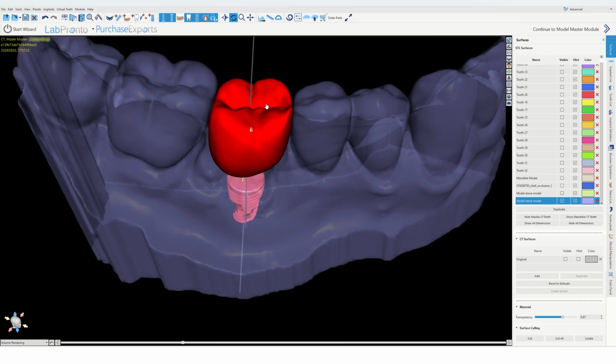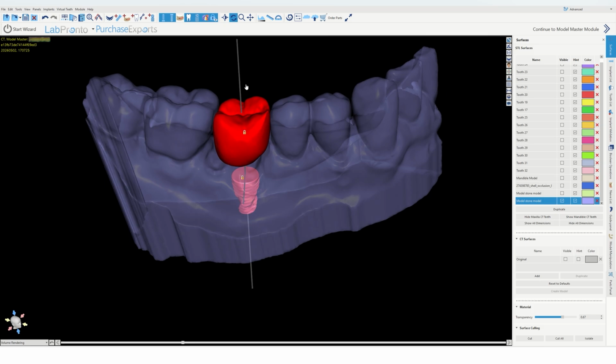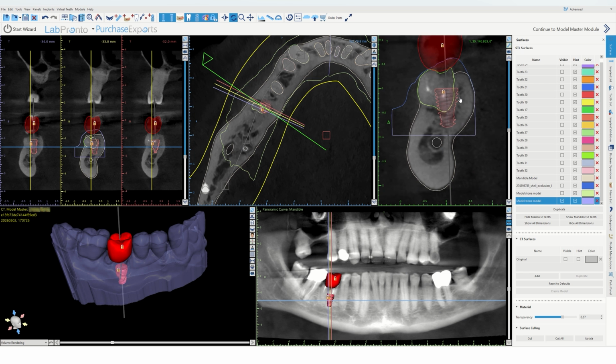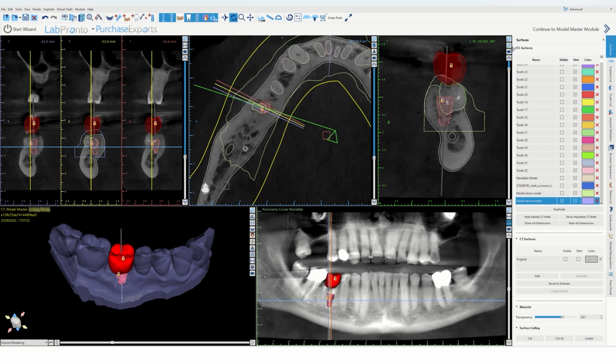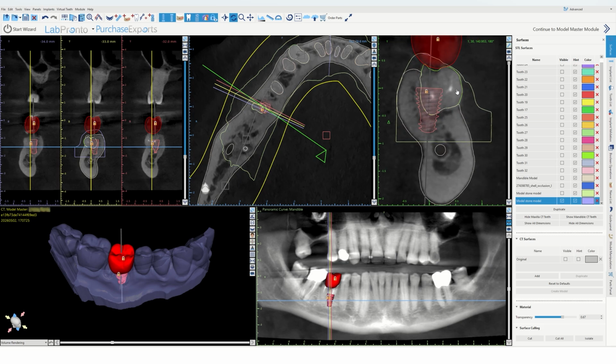This looks better. Now, it looks better on the implant crown, but does it look better in the bone in 3 dimensions? Let's find out. Now remember, this is a 5x8. See how I'm pointing to the center, more or less, the center of that fake tooth. Let's see if we like that. Start at the top. All right, we're still lacking buccal bone here. But remember, the edge of the implant is pretty far away from the edge of that tooth root that will be removed.